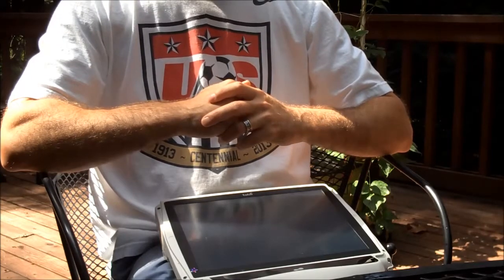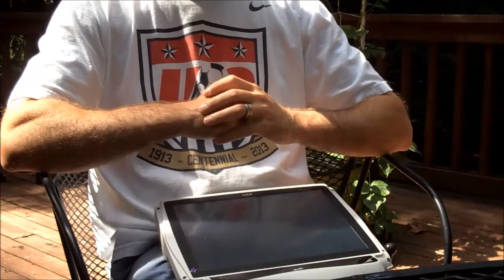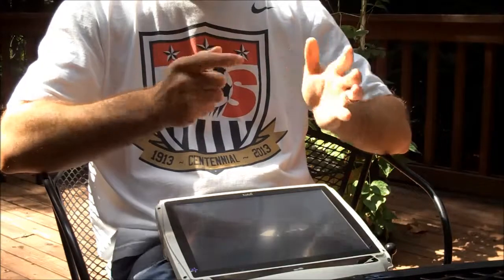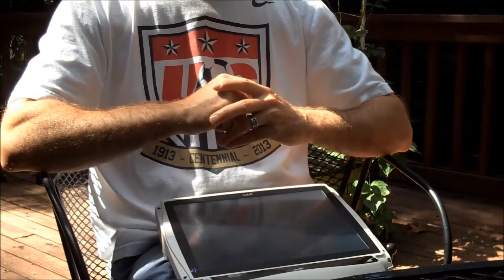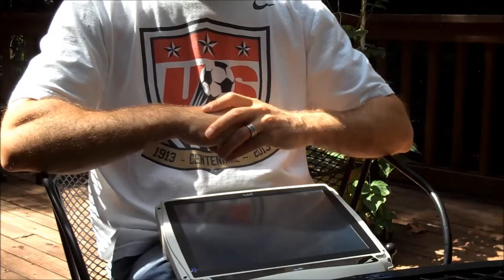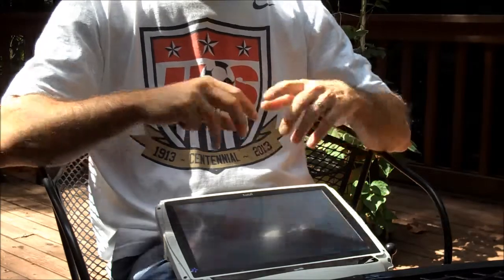So what that resulted in is I created a Dropbox account. I already had a SkyDrive account that had a lot of stuff in it, and I didn't want to tease through all that stuff, so I created a new Dropbox account. And the other thing I like about SkyDrive and Dropbox, by the way, is they're both free. The client software is free, so it helps. I created a Dropbox account. I then set up Jay's Tobii.